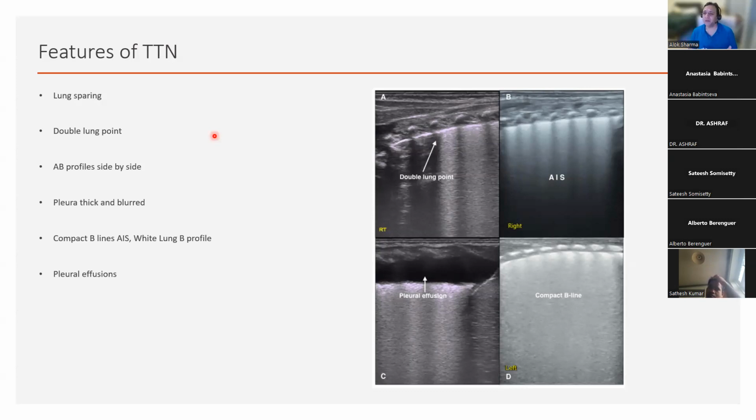versus a baby who's just been delivered through thick meconium, who's got changes of consolidation. We'll show you meconium tomorrow, but where you have a shred sign at birth, now, it could still be infective. Most of those babies will get antibiotics, but actually, really from your perspective, if it's patchy rather than being uniform, then you have meconium. It could reflect meconium aspiration as well.